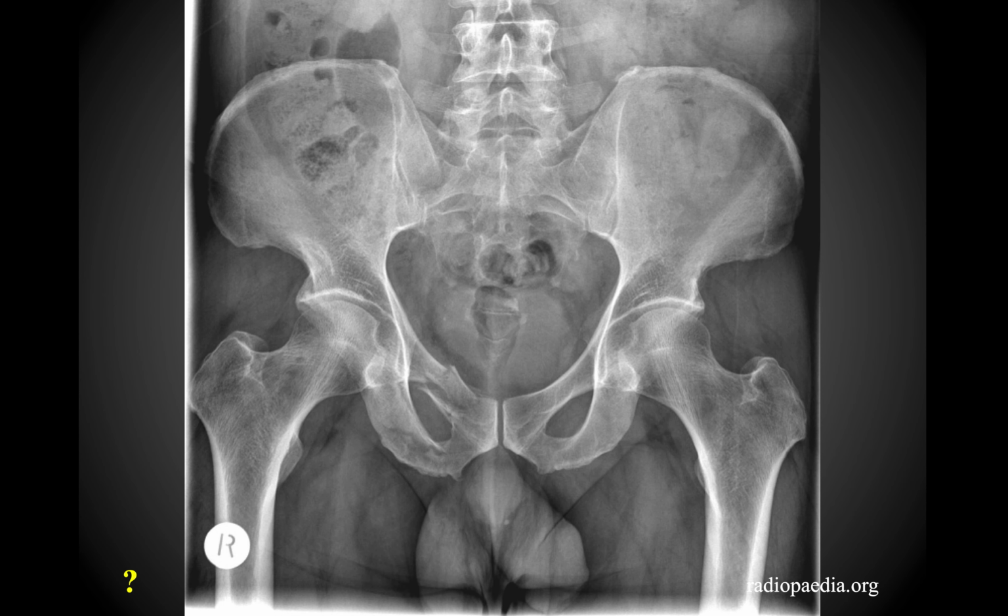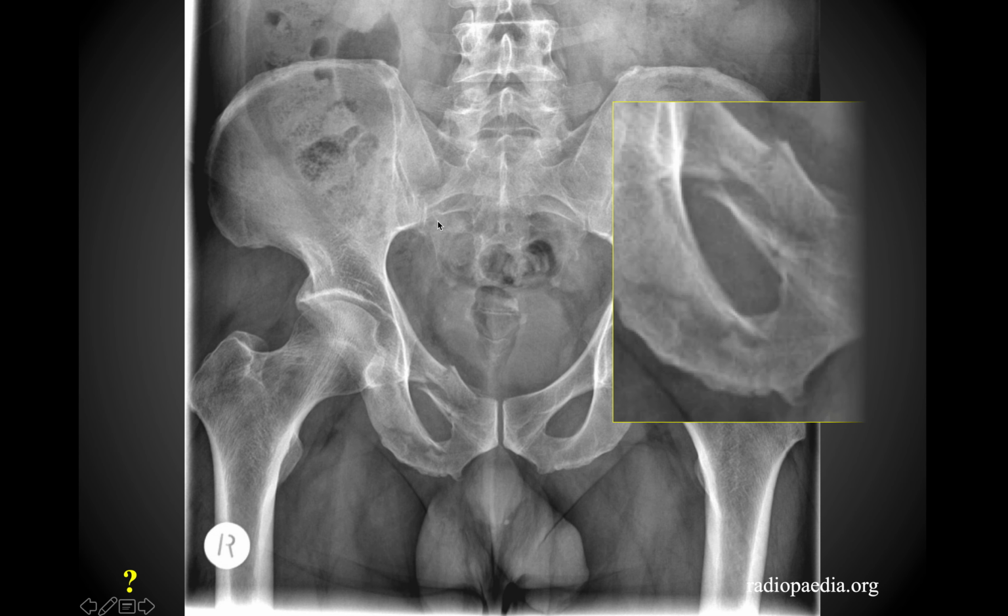And so hopefully the first thing that you notice is when you look at the symmetry left to right at both the pelvic brim, or the iliopectineal line here, as well as along the two obturator foramina, you'll notice that there's this discontinuity, or this asymmetry between the two sides. So here is the location of a fracture along the pubic bone. And then it's much more subtle, but this is the zoomed in view of the fracture there.